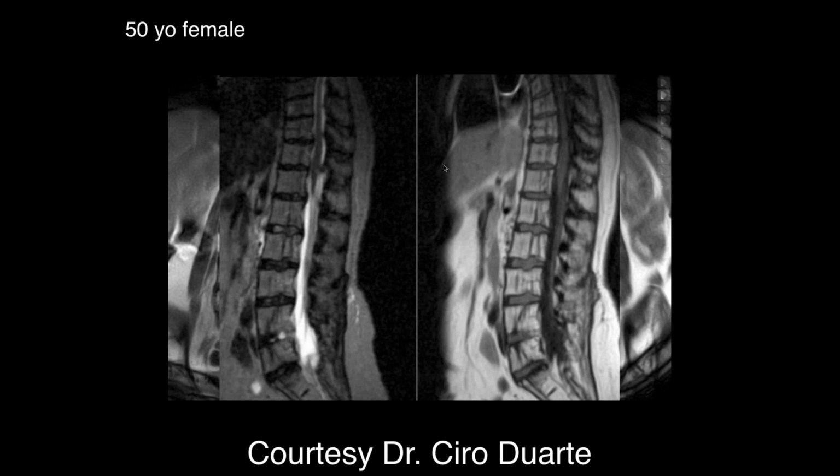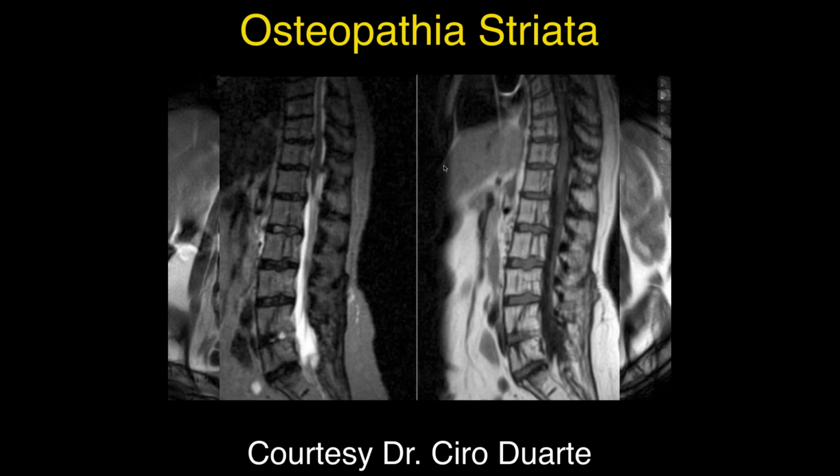too enlarged here, but the thickened trabeculae. So this is osteopathia striata, where you get the thickened trabecular bones and a striated appearance like this, but the size and everything else is pretty similar. And histologically, these look like bone islands. You see that in other bones as well. Yeah, I think so. Yes, you do.